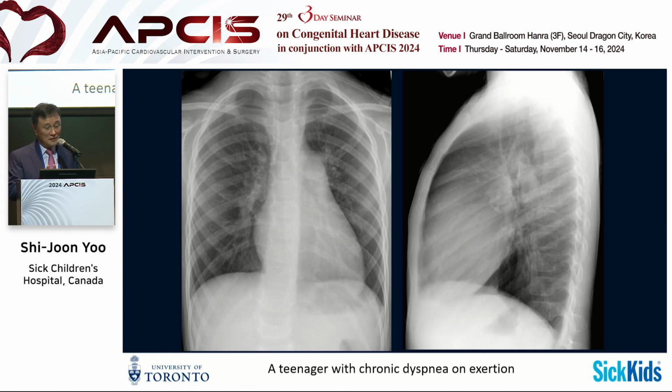Unfortunately, the patient apparently had a chest X-ray, but the chest X-ray was reported as normal, but then collapsed and came to the ER, and then had the finding we found later on. Okay. So what you find here is the prominent pulmonary arterial segment. In the lateral view, can you see there is a mass here? This is not a mass, but a dilated right pulmonary artery and dilated left pulmonary artery, making a mass in the hilar region, and the peripheral vessels are not large.